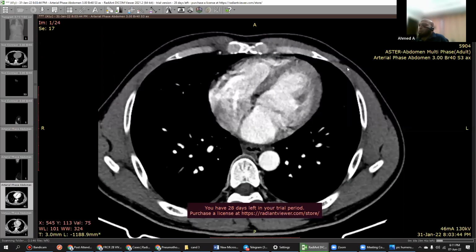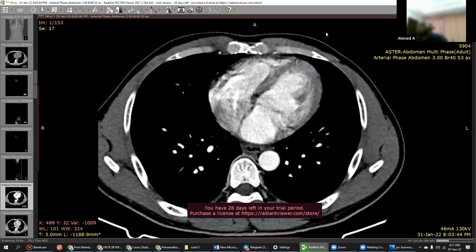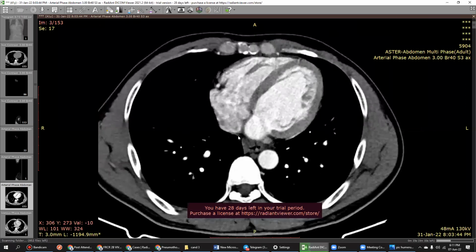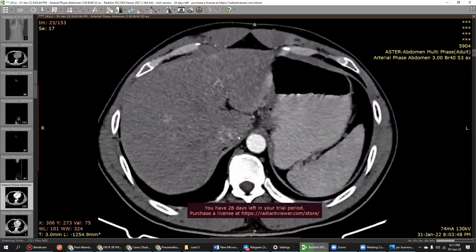Okay, scroll through, please. Can I request for remote? Sorry. Okay, I request now. Yeah, you can do it. Up and down, right? Okay, I will take a look first.